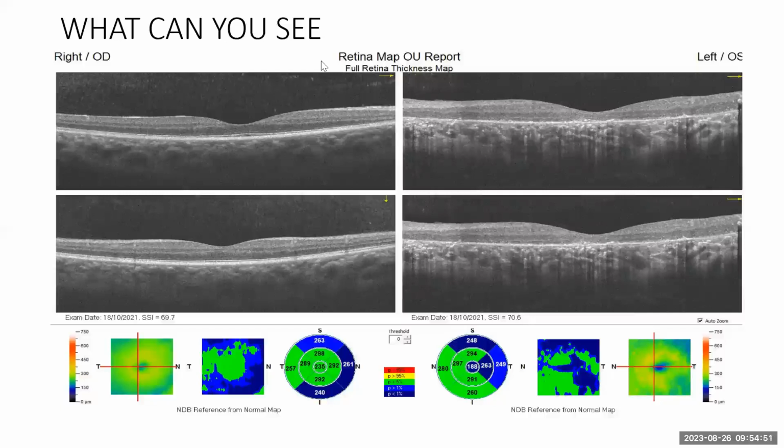But we can see thickening of the choroid, dilated vessels, and some hyperreflectivity. Okay. All right. Thank you. In addition, Dr. Victor, yes, in the left eye, the RPE and the interdigitation lines seem discontinuous.